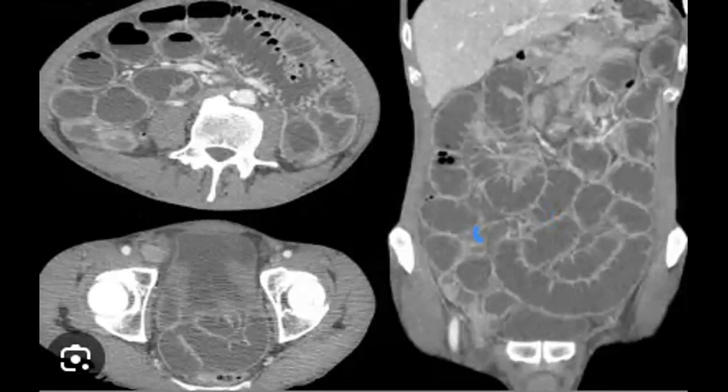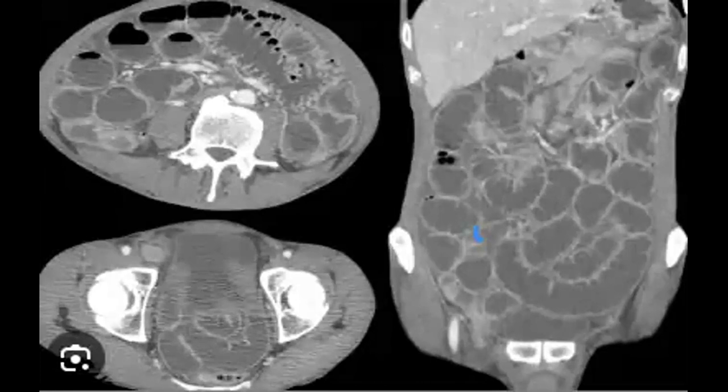And in such dilatation, I will check what could be the reason. If you remember, the last time we talked about this, we think about mechanical obstruction or ischemia, and we said that you have to check first for ischemia, and this is what you did. So perfect.